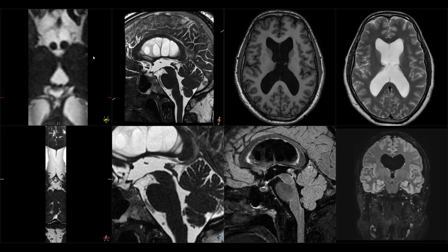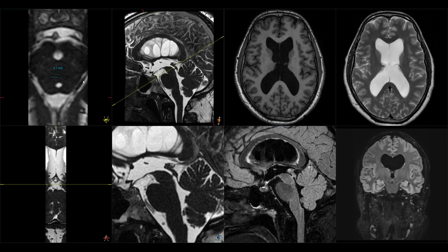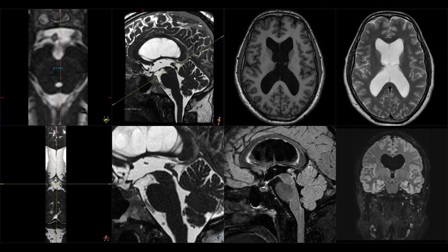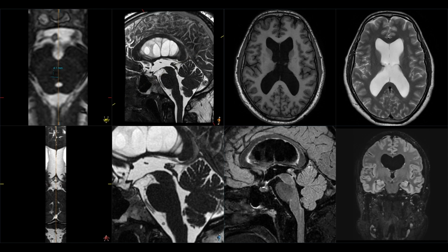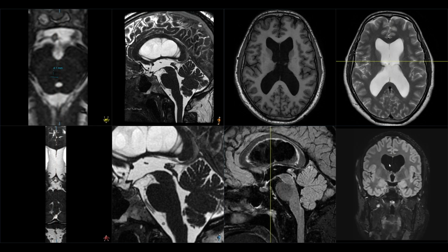So the sequence that we performed is this one. This is an MPR, multiplanar reconstruction of a thin slice three-dimensional packet, that confirms in good detail the thin membrane that is located in the aqueduct lower 1/3. We can also see it here on the zoomed in FLAIR sagittal sequence of good quality. Now this plane is the same as the yellow line that you can see.